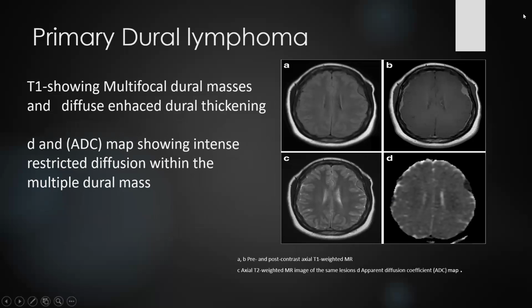In this case, showing multifocal dural masses and diffuse enhanced thickening of the dura. In ADC, showing intense restricted diffusion within the multiple dural masses.